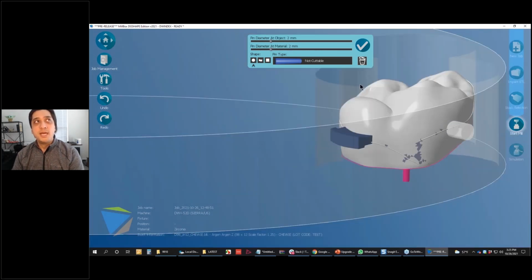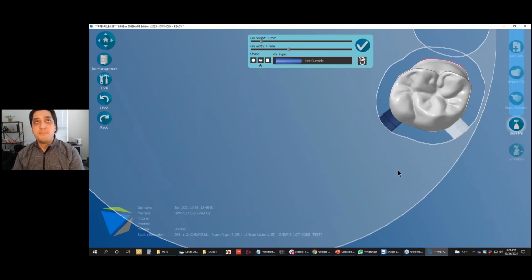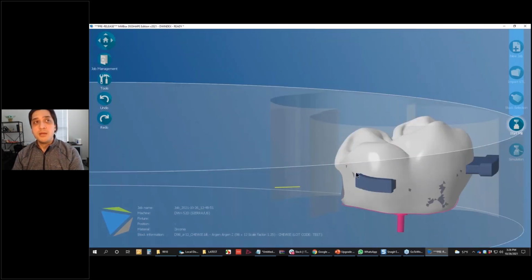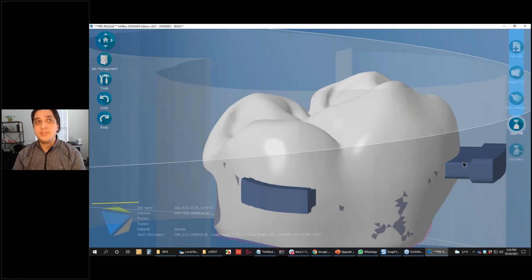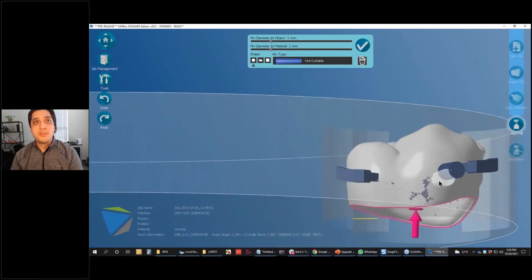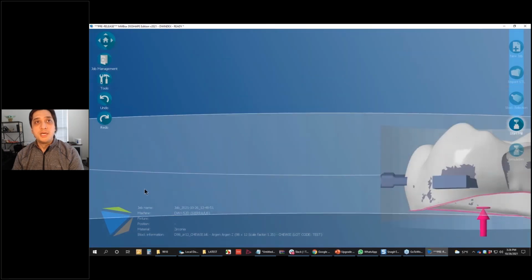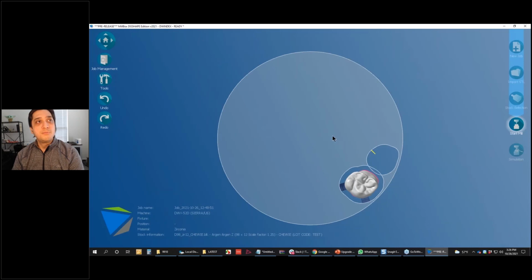It's going to net you a lot better gripping strength on the part because we're holding it a little bit more laterally. And it's also a little bit easier to cut off because we're right there on that line, and it's a little bit thinner in how it engages with the part versus something like a 2 millimeter thick support. You can see the bulk of that is quite different versus our smart support pins. So in order to access those, all you have to do is simply go in here and change the shape depending on what you're trying to accomplish, and MillBox will place that support pin in however you choose. So that kind of covers what the purpose of those smart support pins are.